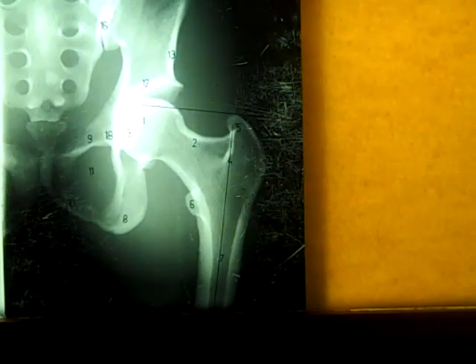If it is not, then you would worry, besides it being a plastic model, you would worry about a fracture of the femoral neck or the shaft portion of the femur. And so that one is called Skinner's.